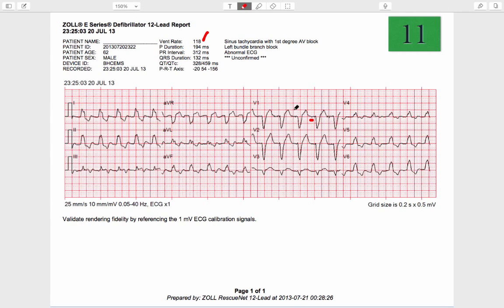But I think what I'm going to say is that there are P wave bumps in there that can be identified, although that may be a little bit of wishful thinking on my part. And so the machine is actually identifying P waves, but it says the PR is incredibly long. So the machine is calling that a P wave and indicating that PRI is excessive, which makes first degree AV block. You look for the QRS, it's also more than 120.